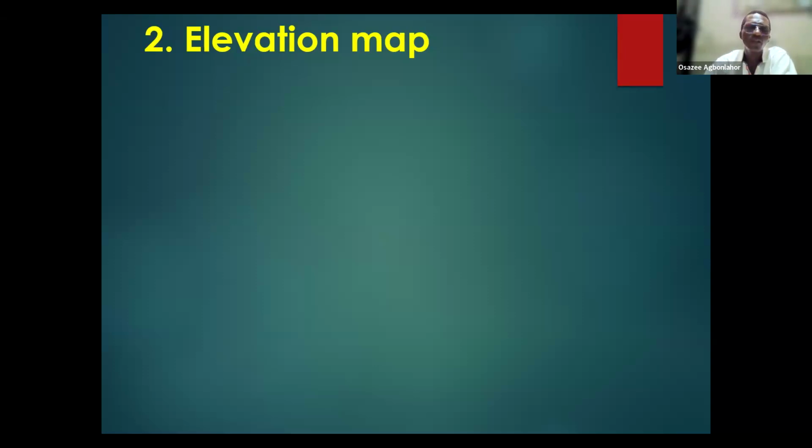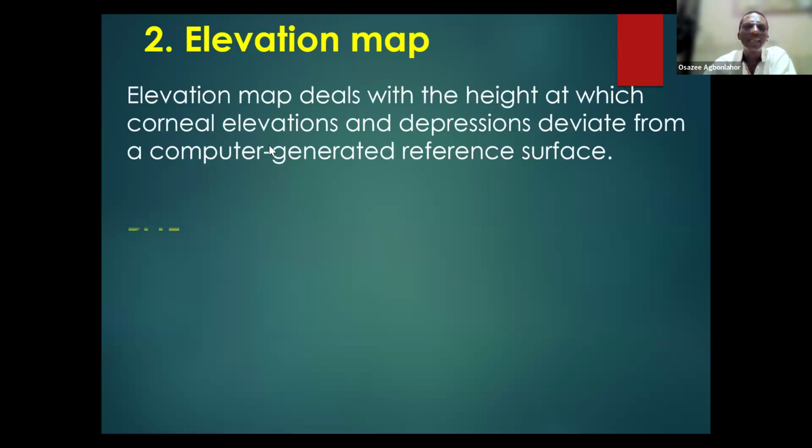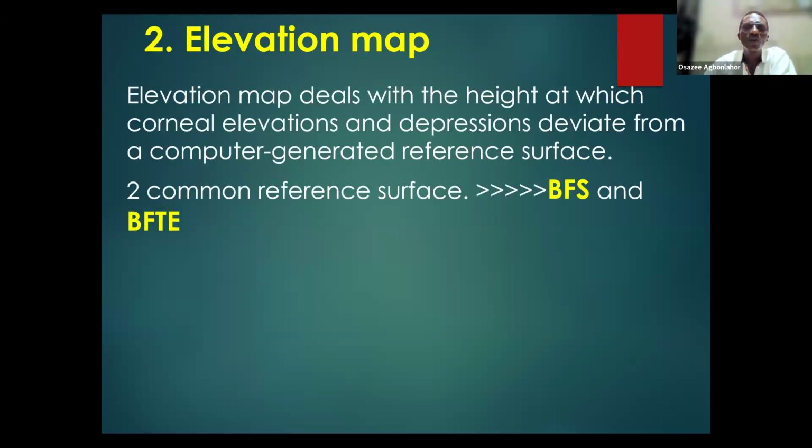Here, it doesn't just talk about curvature, but it talks about height, how high your cornea is.